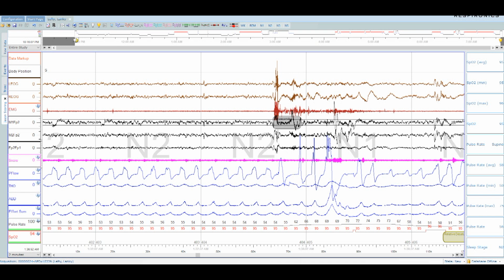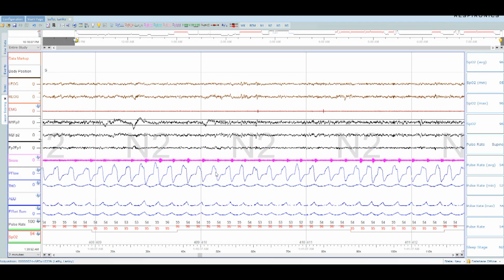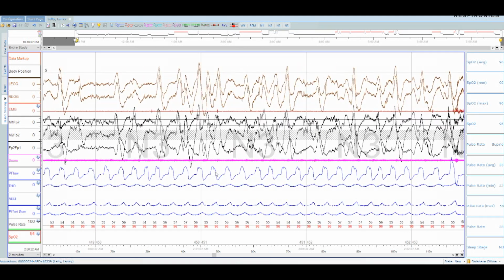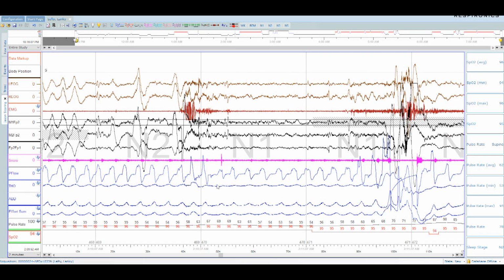My goodness, another arousal. I really think I know what night this is, and I really wish I would stop doing that because I kind of think this is the iNAP night. And I say that because I remember a few times feeling a, oh god, I felt like a pool sweeper that had breached the surface and was sucking water off the top. I think that might be it, but I don't know. I need to forget about that because it's going to cloud my judgment.